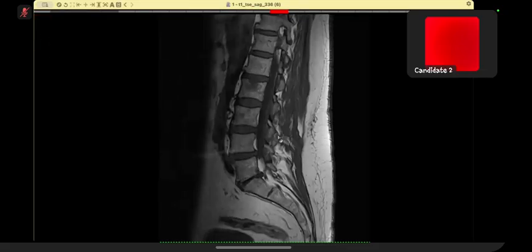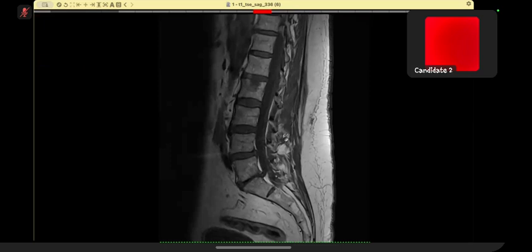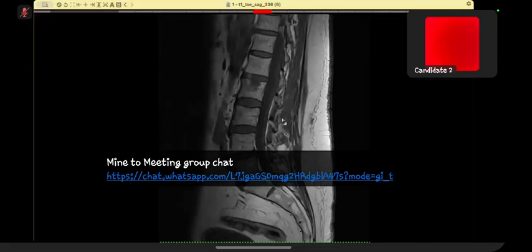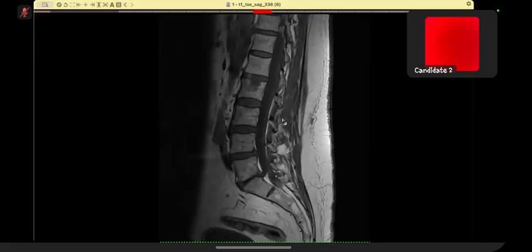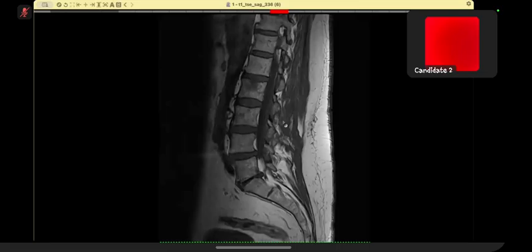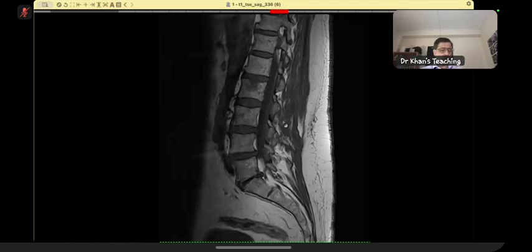This could represent some spondylodiscitis, or it could be a small Schmorl's node. I don't see any obvious collections anywhere else in the spine. So I think this could just be an acute small Schmorl's node in this patient. How will you confirm this? What will you do? First I would like to ask if there are any constitutional symptoms, if there's anything mentioned in the clinical history. I have told you the history. What else can you do imaging wise?